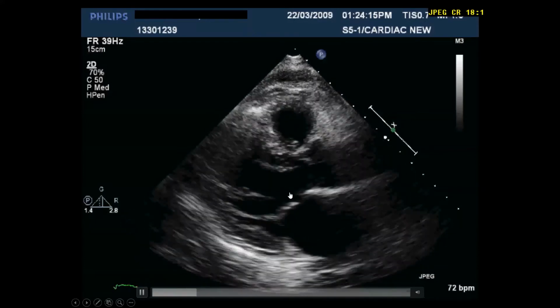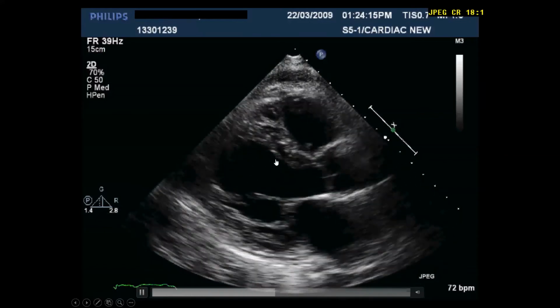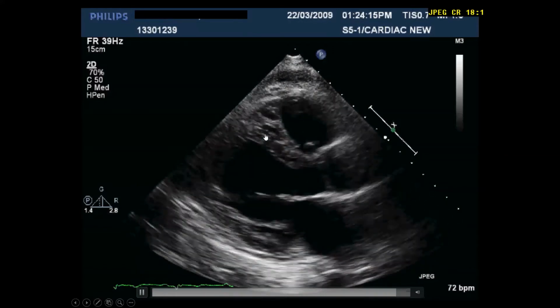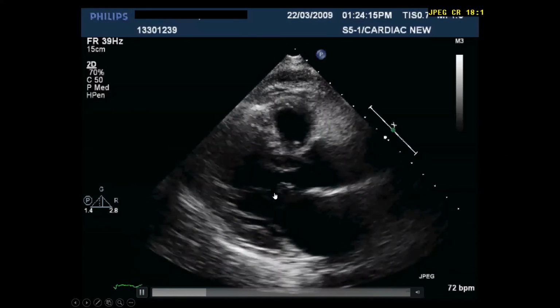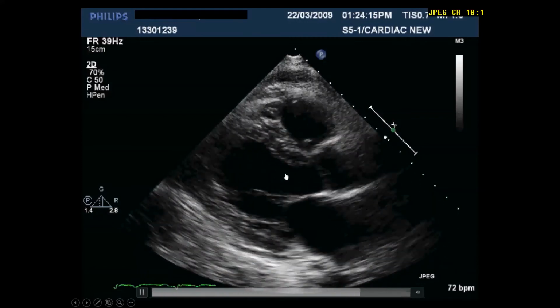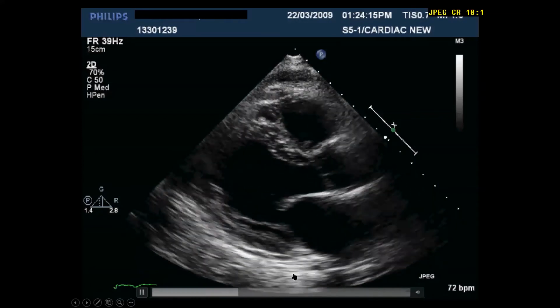SAM, you will see it after the mitral valve closes, then it kinks towards the septum after it closes. When the LV is contracting, you would see that the anterior leaflet jumps toward the LVOT, hitting the septum. So we don't see that. So there is no SAM.